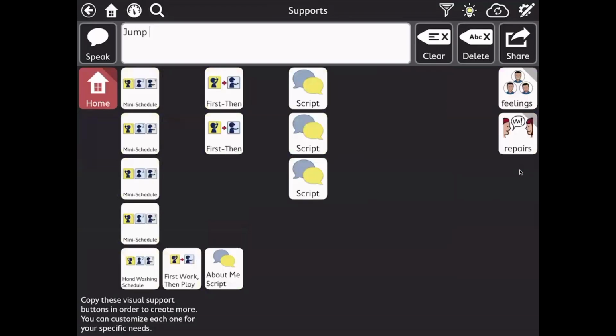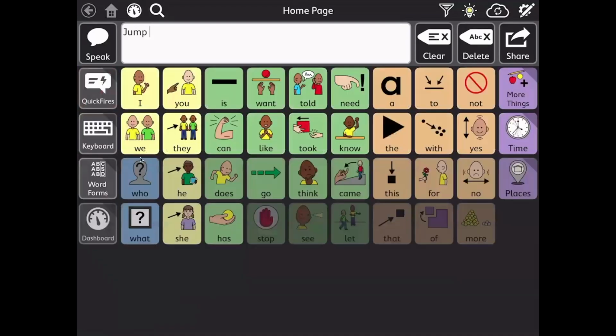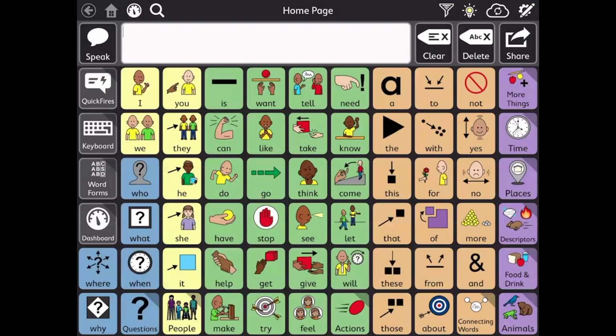Look at real life. Or add in some repair statements that you can edit. In addition to all the ones that are already there, all the black space is a place where you can edit. Okay, I also wanted to talk about the filter feature. That is new and unique to MotorPlan 66, 30, and 40, so the MotorPlan layouts, as far as I know. I don't think it's in Express. I think it's just in this profile.